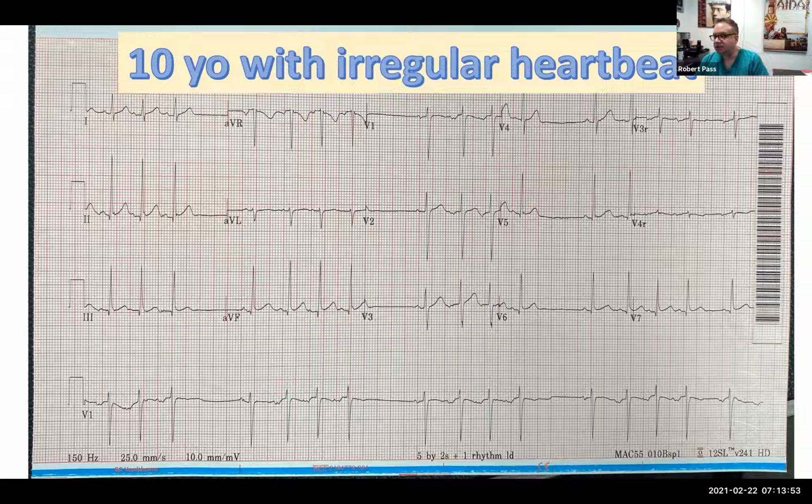The most common location that ectopic atrial tachycardias arise from is the orifices of the pulmonary veins. But the next most common is in the right atrium, oftentimes near the right atrial appendage. So this looks like it could be maybe at the base of the appendage or near to that area. So any of those would be reasonable. In this particular case, the patient's family elected to continue to monitor this. And so we're going to repeat a tracing in a couple of months and see what follows.